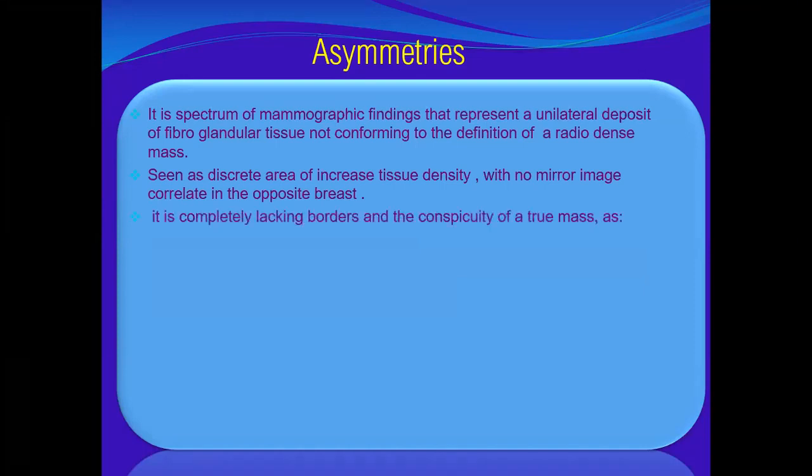It does not fulfill the criteria or the definition of a radiodense mass, and it completely lacks the borders and conspicuity of a true mass.